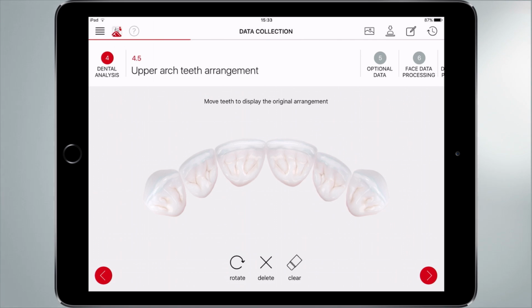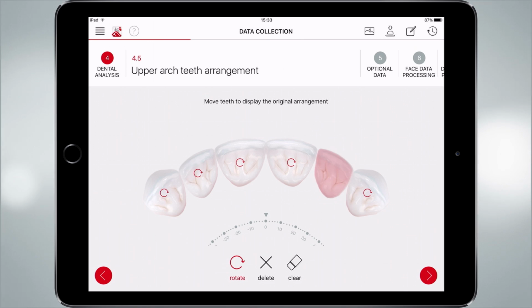I don't like either. What would you like to accept? Let me check. Now I can rotate this. I accept some rotation. Do you like this like that, like that? Or, on the contrary, do you like it to be on the other side, to be more internal, like this one, this moment here? So this way you can better explain what is your intention and what they prefer in terms of moving the teeth, if it is needed.